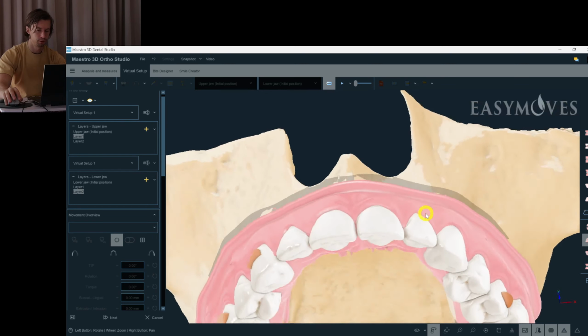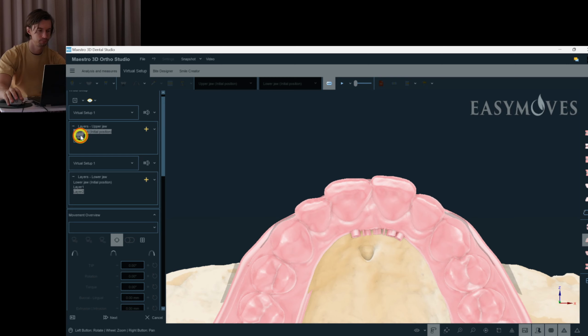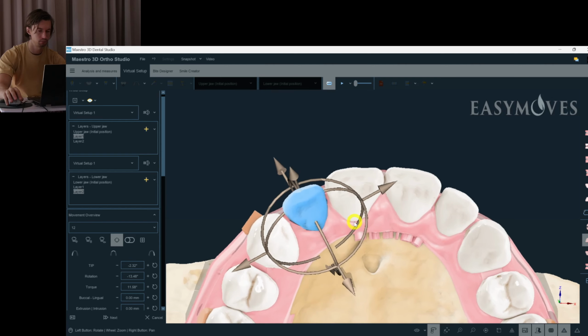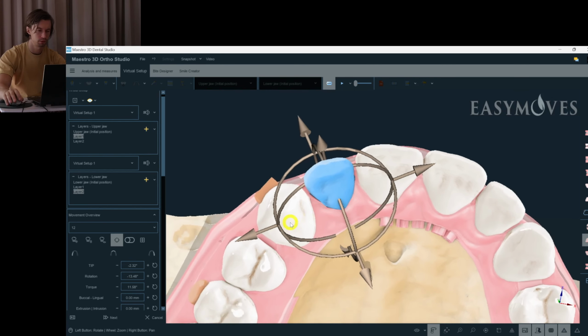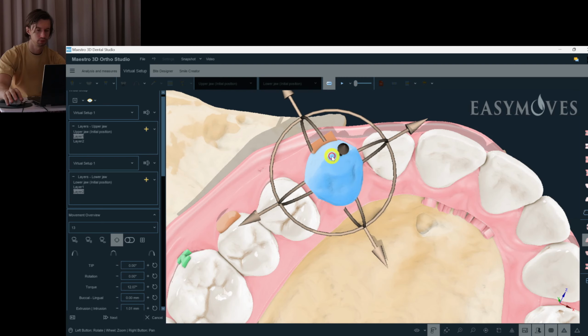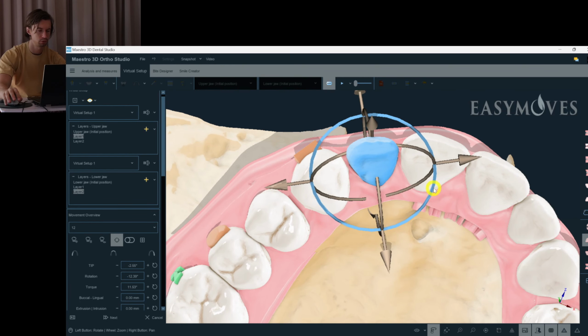And do we need any negative attachments at the upper jaw? I think not really. Here we can add it, but it's gonna create some unnecessary tension in this area of the liner, and it can affect our extrusion, which I don't want.